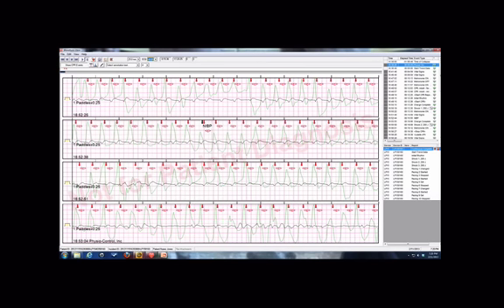This is what the raw data looks like. Before we print the reports, you can go through every second of the resuscitation. The black line is the electrical activity, like the rhythm strip you would see on the monitor. The green line is what we call the impedance signal, or effectively where the compressions are. This is measured by the electrical energy passing back and forth between the pads, and it can measure how that is disturbed by the compressions.